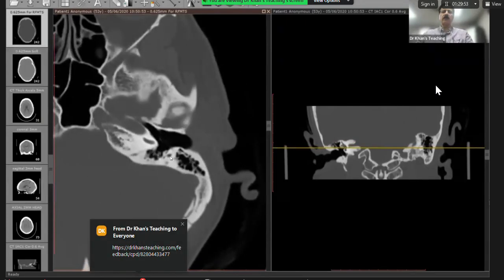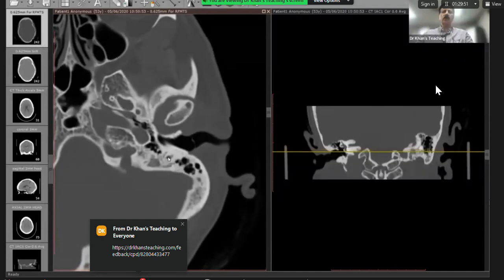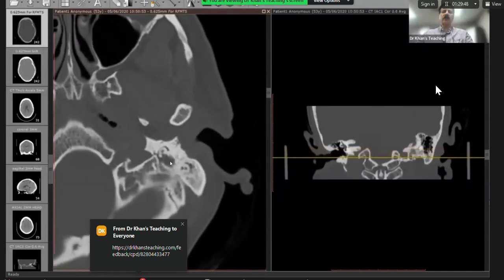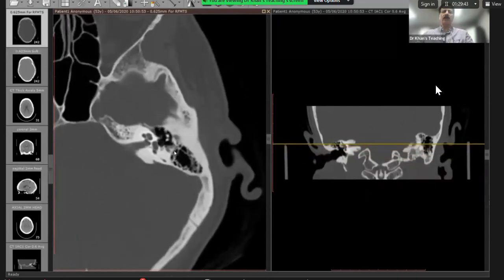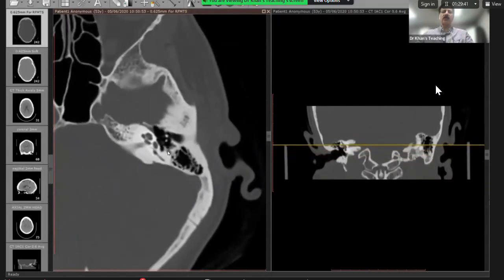So we are at the posterior wall. And ultimately it will go out. So we trace it backwards. Now, this is a landmark on the posterior wall of the mesotympanum, where you can see this pyramidal eminence where I'm pointing out. And it will be next to the septum, which is visible here. This is the descending facial nerve. This portion where I'm pointing out is known as the sinus tympani.